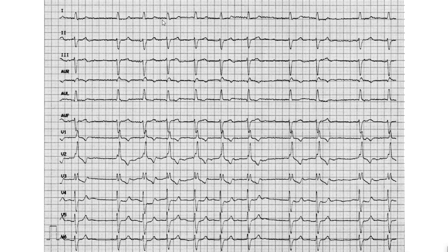No, you skim through it and you check, and nothing seems out of the ordinary. You check the other leads, and no, there's no very strange morphology, and there's no single place where it looks like the rhythm is particularly extra, if you get what I mean. Also, the idea is that nothing pops out which was unexpected. This is just some long, empty phase, then it's slowing down, and then there's an emptier phase here, slowing down. So it's not proper, you know.